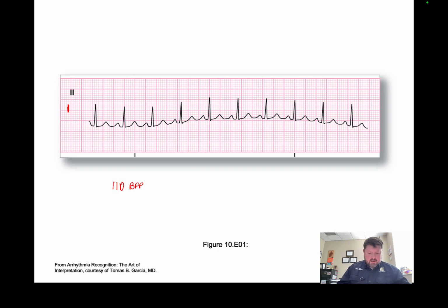What about my regularity? Well, let's take our calipers and look. Measuring every R to R shows that it is regular. What about my P wave? Well, all of my P waves are good. They're uniform, upright, present.